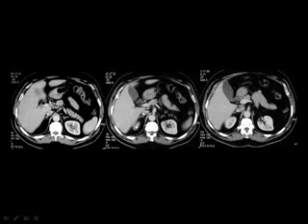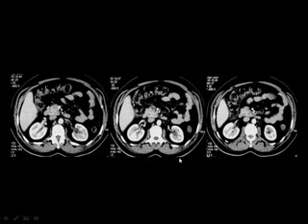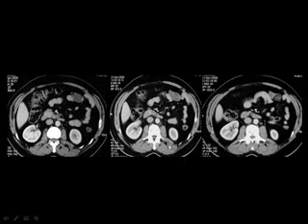You start to see the kidneys, the spleen has finished, and you see some of the bowel loops inside the abdomen. Going further down, you can still see part of the liver, the gallbladder, and both kidneys, and you can see the left renal vein crossing the midline to join the inferior vena cava in front of the aorta. Then further down, you can see the region of the pancreatic head, the distal part of the liver, both kidneys, the aorta, and the IVC.